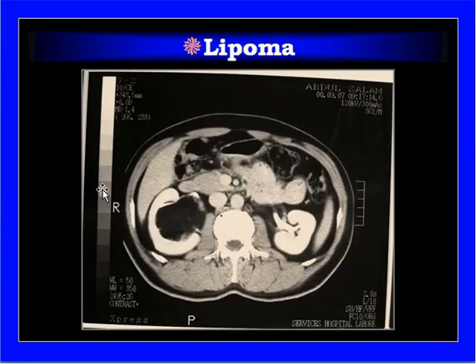Lipoma, not very common again. If you look at the right renal pelvis, you see the renal pelvis is occupied by a very low density structure which is comparable to the adjacent fat, with very fine septation inside. This is not a cyst, but a large lipoma present in the right renal pelvis, which is slightly displacing the renal cortex. Contrast excretion is intact. Left kidney is normal.